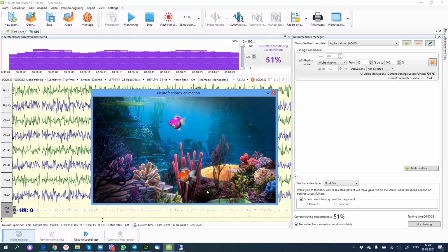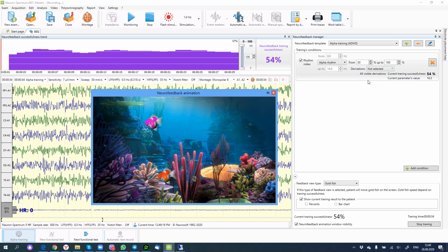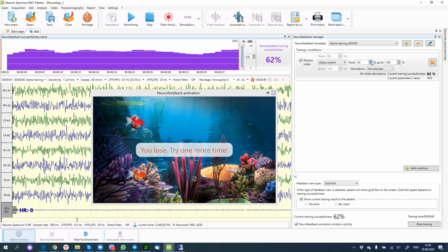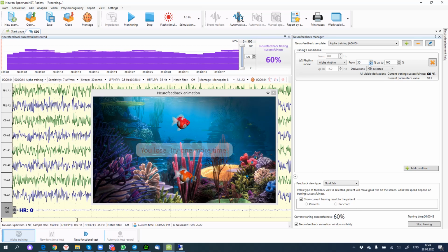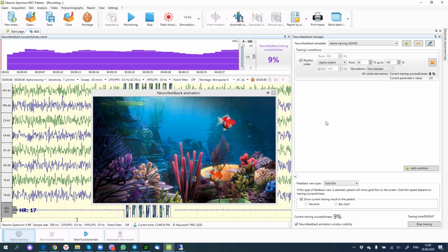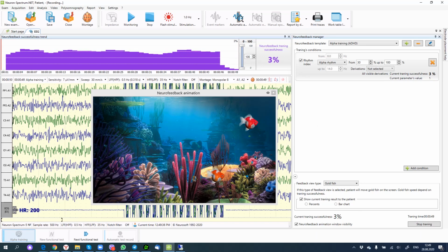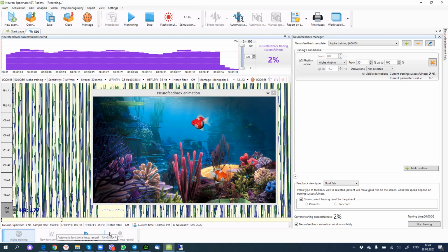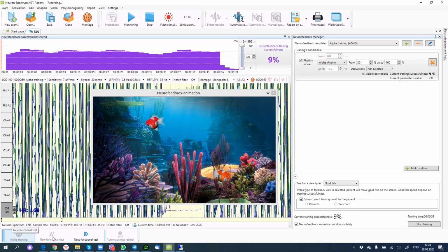It's quite a flexible mechanism where you can set up any parameters, before acquisition, before training, during, and you can review it after training. Here you can see the progress bar of the current test, and here on this button you can see the progress bar of the whole script, including all your selected tests.